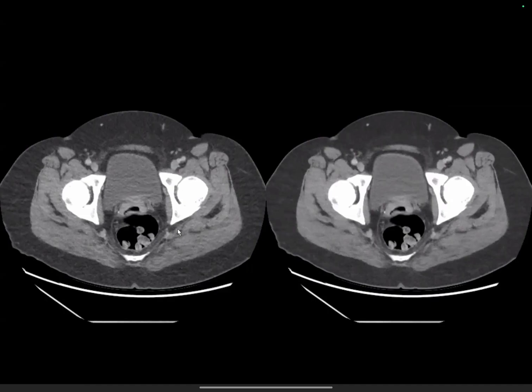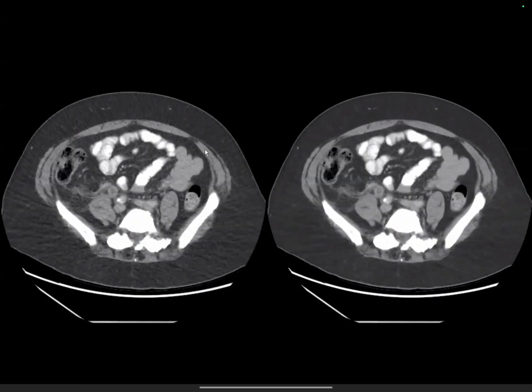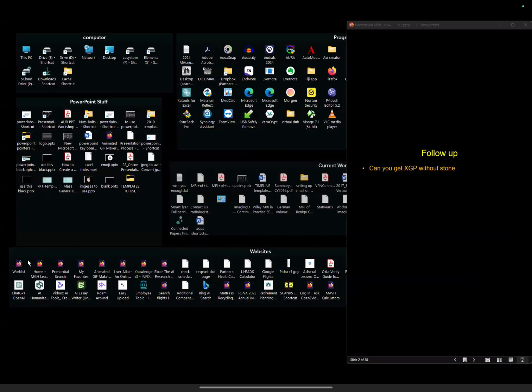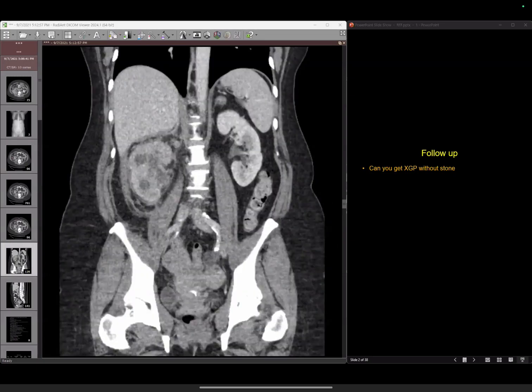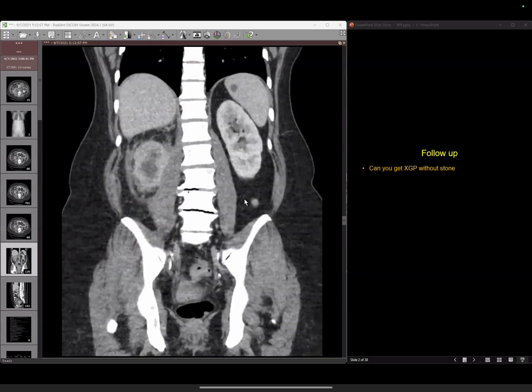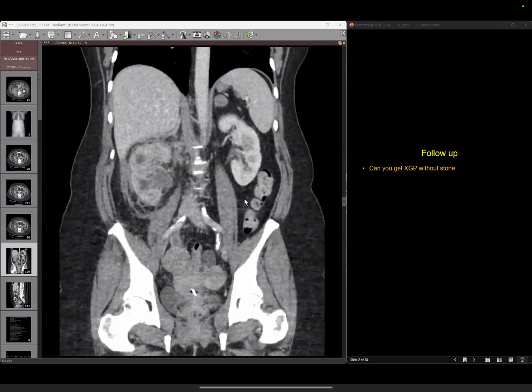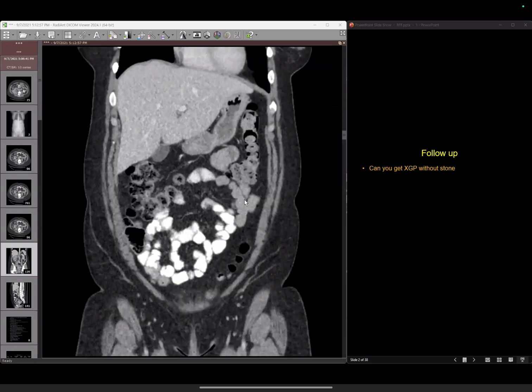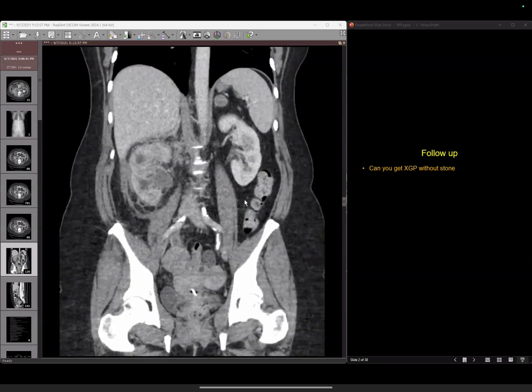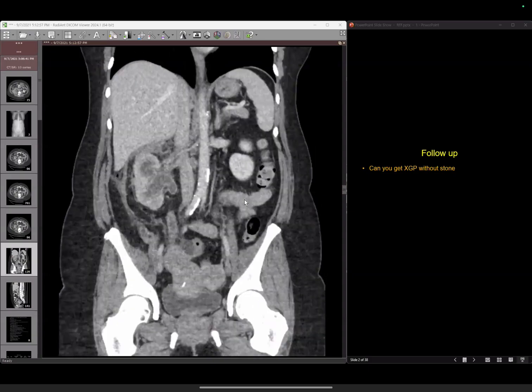Yeah. As it is in the bilateral, you can see in the adnexa, bilateral adnexa. So this might be the Krukenberg, that is, the metastatic deposits on the ovaries. Perfect. However, go ahead. I can't see any other peritoneal deposit.